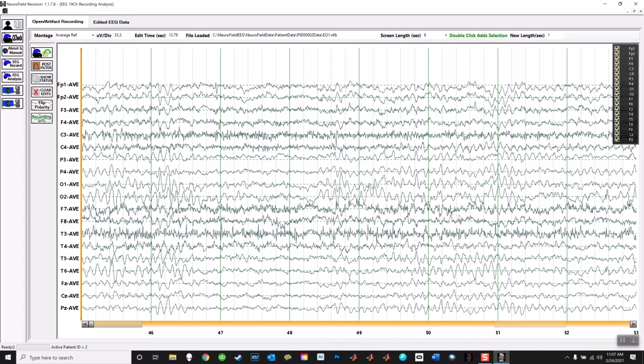And then you look at T3, T4, and look for jaw or muscle. And you also look at FP1 and FP2 and look for jaw or muscle artifact. And if it's negligible and low, then you can say, well, this is acceptable. If it's not, then you omit the piece of data. So I go through those pieces of decision making when I'm selecting data. There's far more to learn about morphology and how you actually do this, but that's a good way to start.